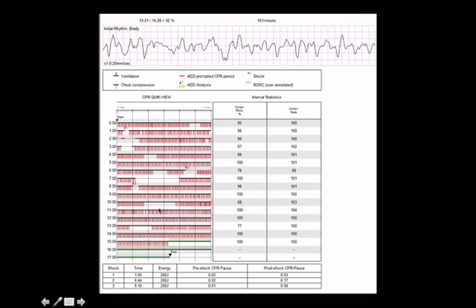There are a couple other annotations that you'll see in this section. This green bar here refers to return of spontaneous circulation. So here is where a pulse came back, and for this green period until the end of the resuscitation, there was a pulse back. Occasionally we will annotate these with ventilations, which will show up as little blue triangles up above here. However, that data is not quite as reliable as chest compressions, so for now we're relying on the program only for interpretation of chest compressions.